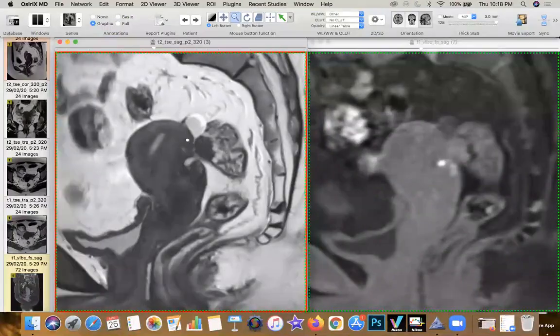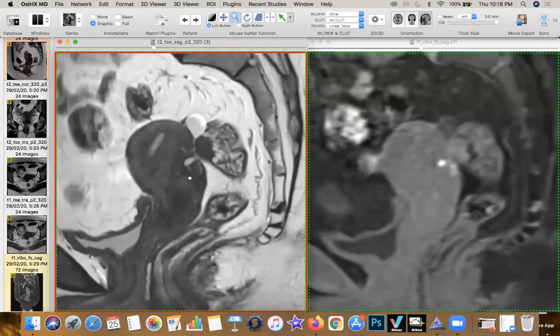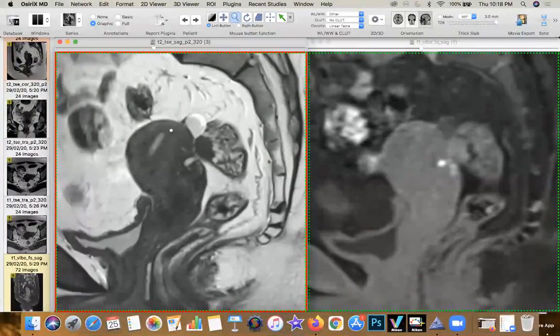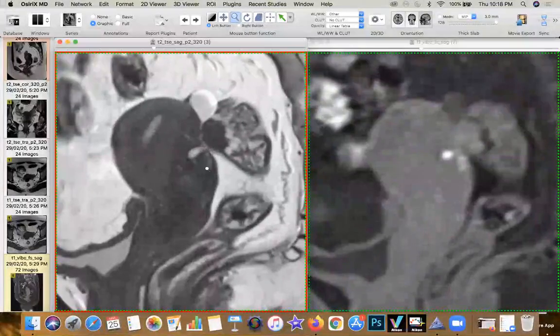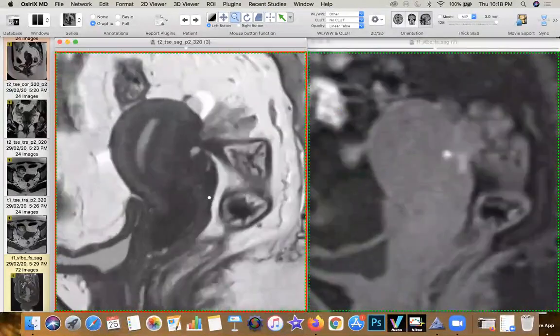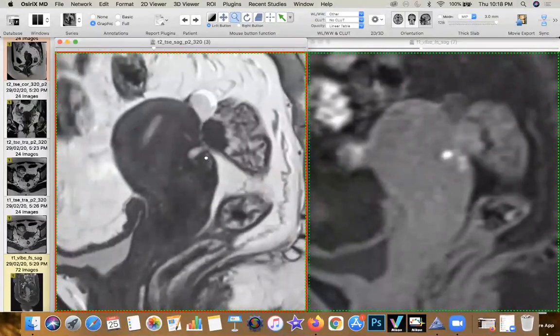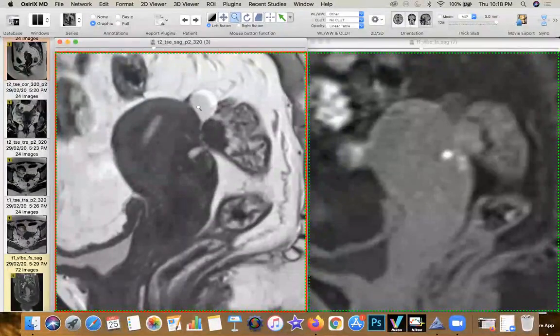You see invasion of the subserosal posterior myometrium. You can see that altered signal sitting up here. You can get dilated endometrial glands here. This is pseudoadenomyotic because the normal junction zone is completely spared. You can see that because of disease involving this location, it's in very close proximity to the torus uterinus and the uterosacral junction. You can see that the posterior wall and the fundus are retrotipped. There's tethering of the rectum, and there is full thickness rectal wall infiltration.